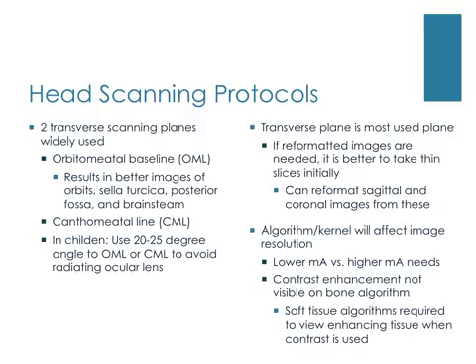Contrast enhancement is not visible on bone algorithm or bone windows. Also, when contrast is used, images on soft tissue algorithms are also required to see the enhancing tissue, such as within sinus tumors and chronic sinus infections.